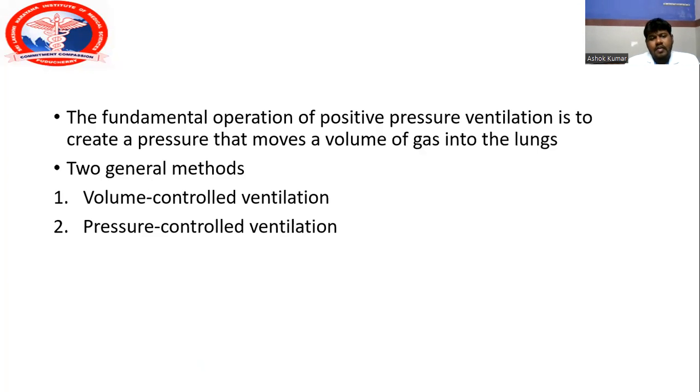Then the following pre-use checkup should be done. First, start with the internal test. The internal leakage test and main test will be done. Finally, the battery backup checkup, patient circuit test and alarm setup are all to be done. Then we enter the patient data. Finally, the ventilator will be in standby mode. We can start the ventilation by clicking the start ventilation button.